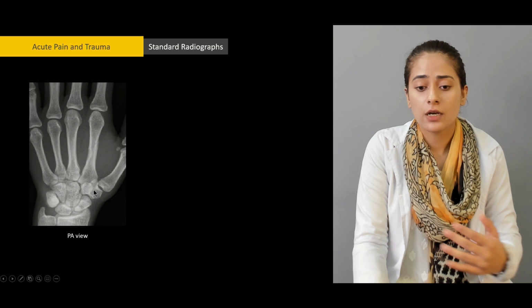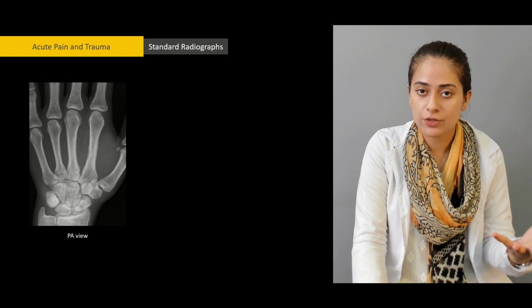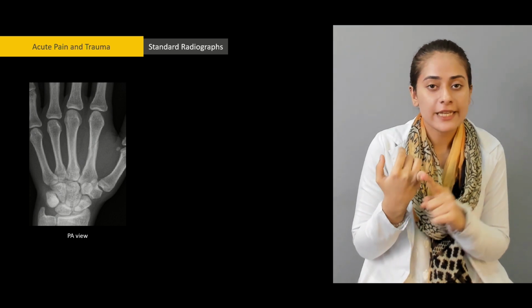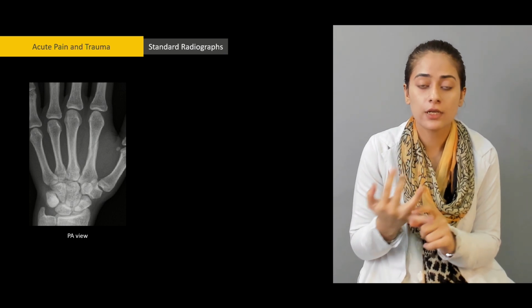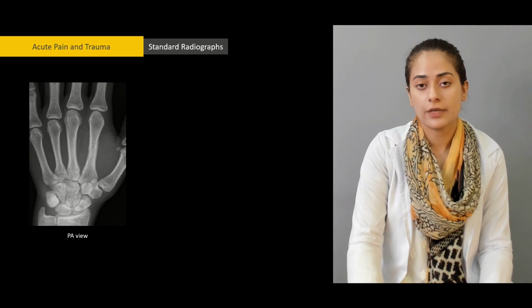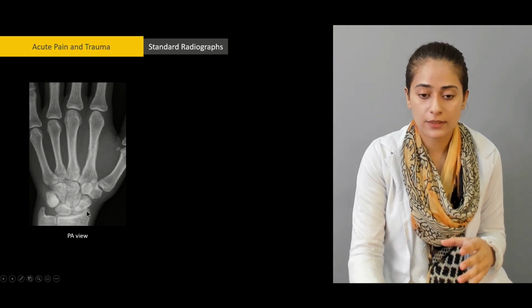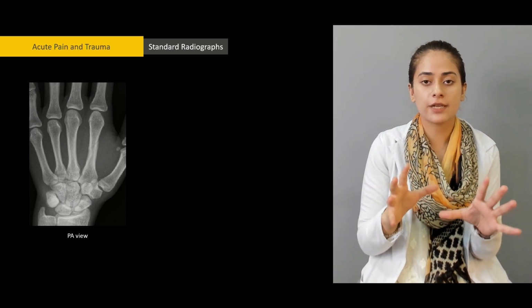We have scaphoid, lunate, triquetrum, and then pisiform. In the upper row we have "try to catch her", so it's trapezium, then trapezoid, then capitate and hamate. Hamate is the last of the carpal bones. So the carpal bones are visible. This here is the hamate. We'll look at a clearer picture to visualize all of the carpal bones in detail.